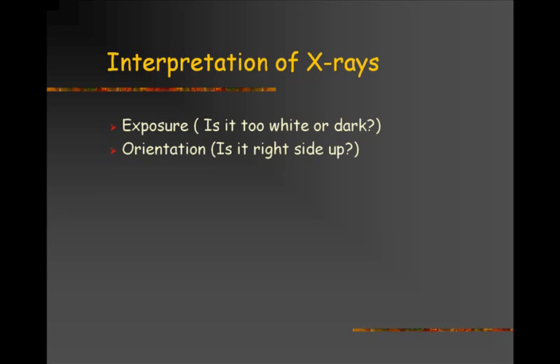It is important to make an assessment of the orientation of the X-ray presented. Am I looking at this X-ray right side up? It is equally important to make an assessment of the position of the patient when the X-ray was taken. Was the patient seated? Was the patient lying down? Was the patient supine or prone?